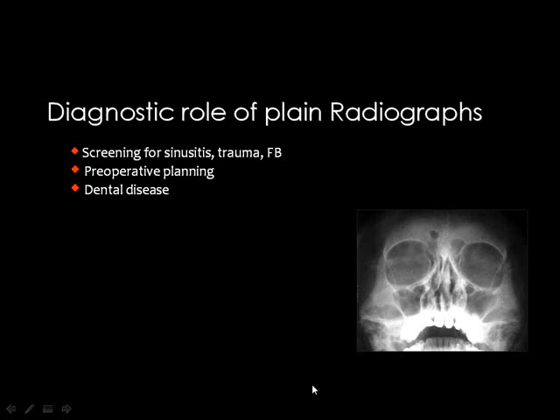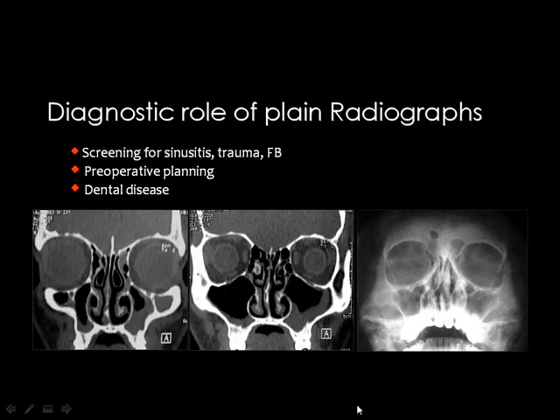And actually, you know that the X-rays of the paranasal sinuses should still have a role in the diagnostic battery of paranasal sinus disease. But actually, this role has declined very much in recent years because of the availability of other imaging modalities, particularly CT and MRI. Paranasal sinus radiographs are still used for screening of patients for sinusitis, looking for the effects of trauma on the maxillofacial area, and also in preoperative planning and some cases of dental disease.